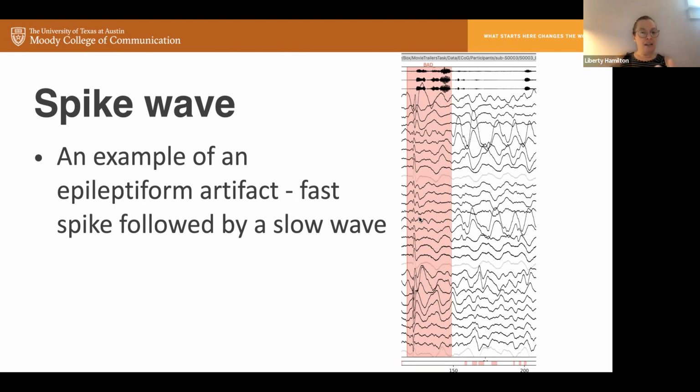If they are in a convulsive seizure, you might see these across many channels, all synchronized and rhythmic. But if you see one of these kind of one-off every now and then, then you can mark it as a bad channel, and I'll show you how to do that.